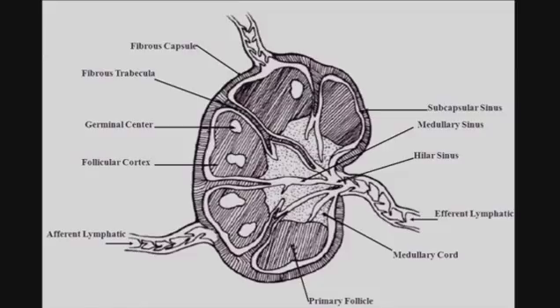I want to talk a little bit about sentinel lymph node biopsy, and just to indicate that this is where we've given the injection in the breast, that we see three areas of uptake in the axilla. Now, this does not necessarily indicate that these lymph nodes are positive, but rather this is indicating that this is where there's sentinel lymph node uptake, and then the surgeon will take out these three lymph nodes, and then the sample will go for careful histopathologic evaluation.